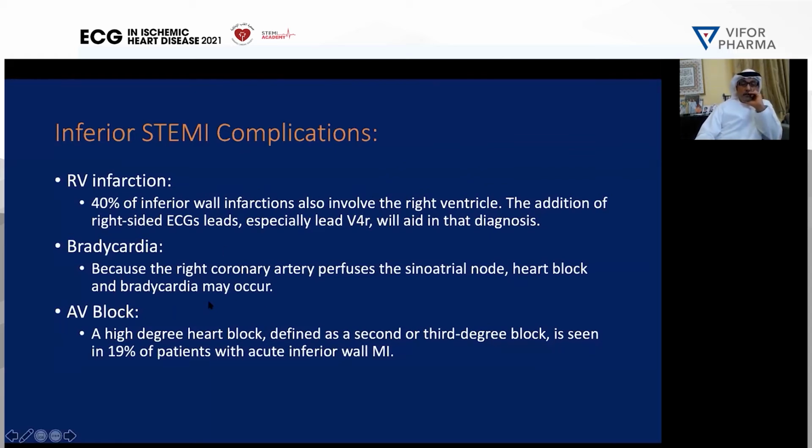Bradycardia, because the right coronary artery perfuses the sinoatrial node artery, and heart blocks can occur. AV block, we saw it on this ECG. So remember, it's a STEMI, and it is the complications of the STEMI that you need to be looking for. So watch for the complications.